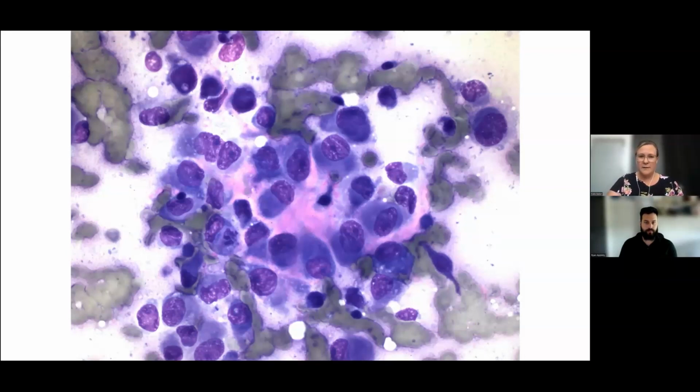They also don't look epithelial because epithelial cells like to stick together, and these cells are close to each other, but they're not stuck together intentionally. So this is a mesenchymal population. And then we have to think, okay, do we see criteria of malignancy to support that this is a sarcoma, which is a malignant mesenchymal tumor? And so we're going to look at that.